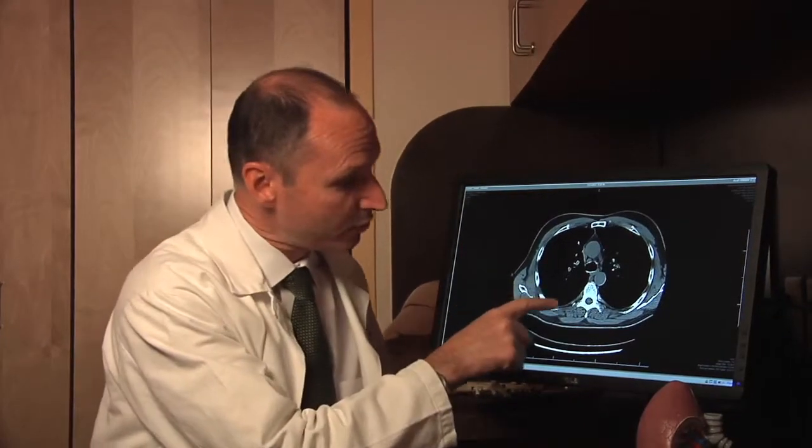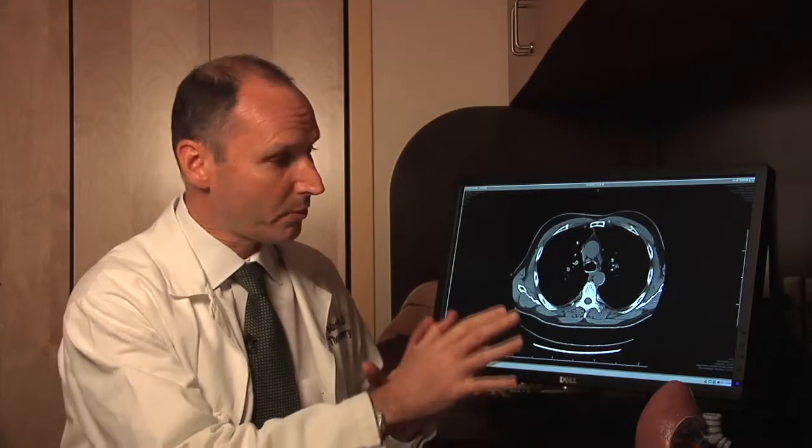The other things we can see on the CAT scan relate to whether the cancer has spread to the surface of the lung or the pleura. Sometimes we'll see a small amount of fluid on the CAT scan. And sometimes we can even see if it has spread to involve the liver or the adrenal glands. But the main purpose is I wanted to show you here what a CAT scan looks like and how to understand how to read it.